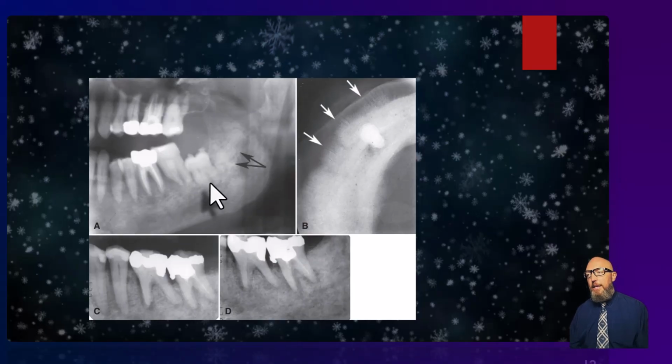This to me looks like an osteosarcoma, or it looks like something that's a radiopaque malignancy. Now, if I told you this was a male patient with a history of prostate cancer, hopefully that would hone you in on the exact diagnosis. This is prostate metastasis. This one also was a male patient, history of prostate cancer. It also looks just like osteosarcoma. See that sunburst appearance in our occlusal radiograph here of the mandible? So if it looks like osteosarcoma, you also want to compare with a history and see if they have a history of one of these opaque cancers that can metastasize, either breast or prostate.